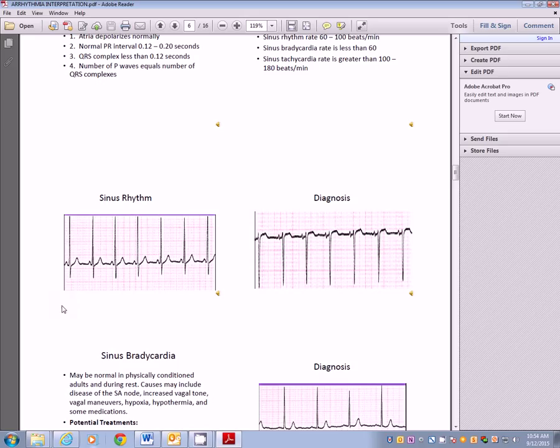Now this is when you would get a piece of paper out and walk them off to see if they are the same. You would get your paper up here and mark, and then walk these off. Same, same, same, same, and same. So they walked off. You can also walk off your P's if you want to. They should be about the same.